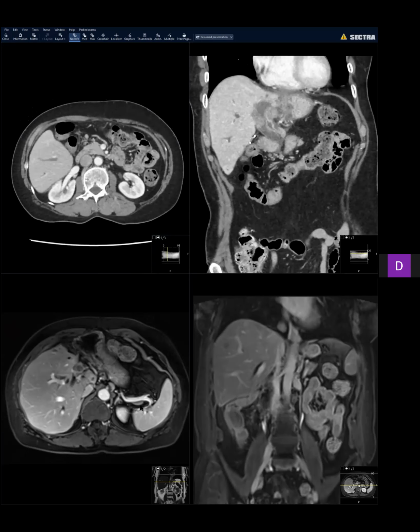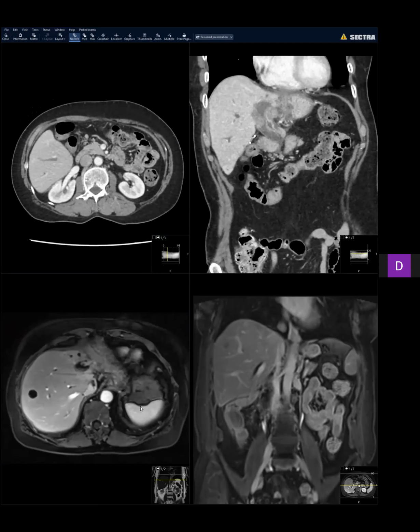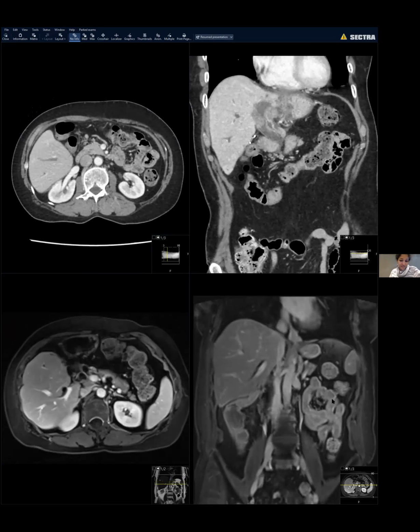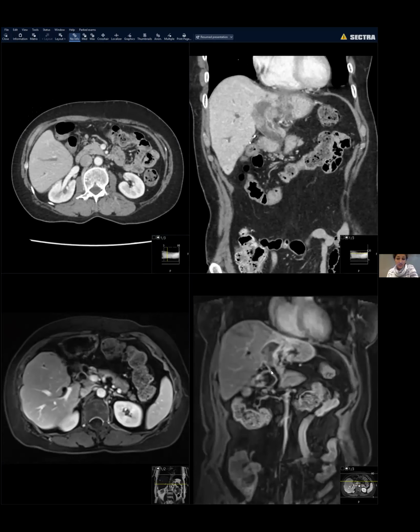Axial. This is MR, maybe better contrast resolution on MR. So focus is on the bile duct. Yeah, it looks like there's a lot of thickening of the bile duct. Steve is asking maybe if it's a cholangio. It's a form of a cholangio. Soft tissue growing into the bile duct, Anu says.